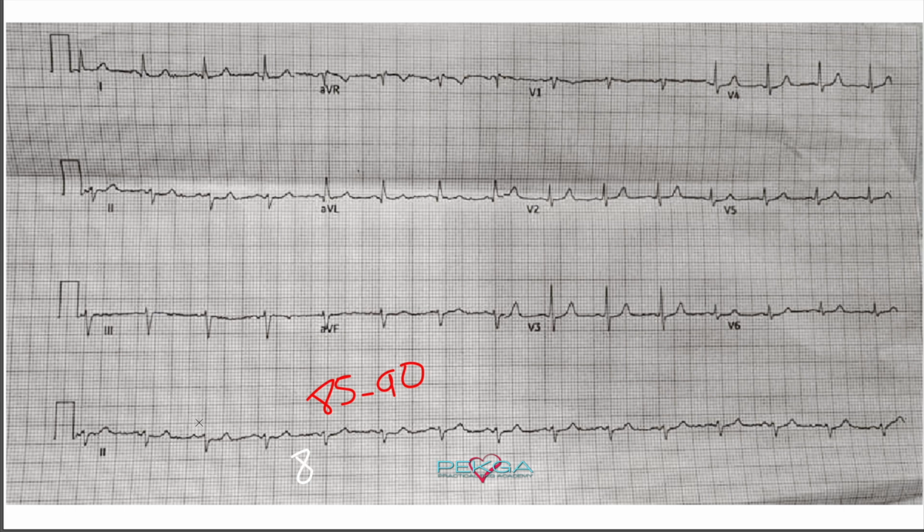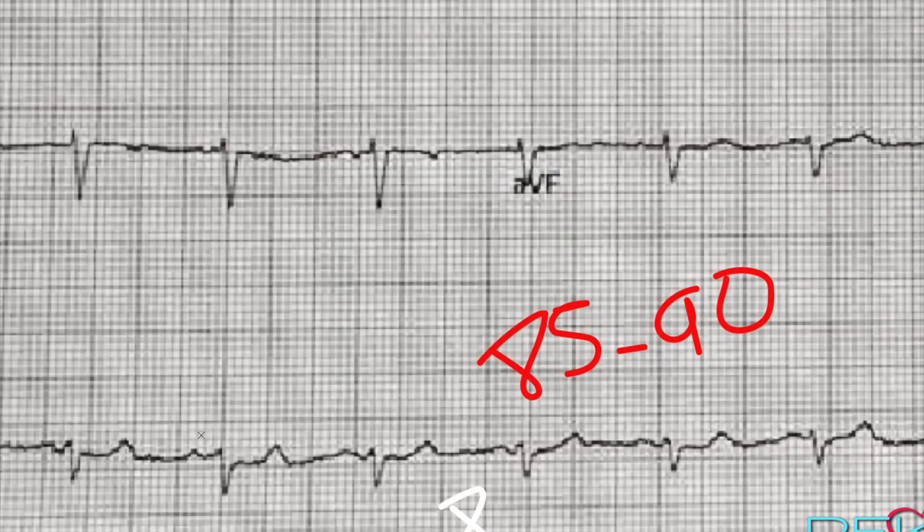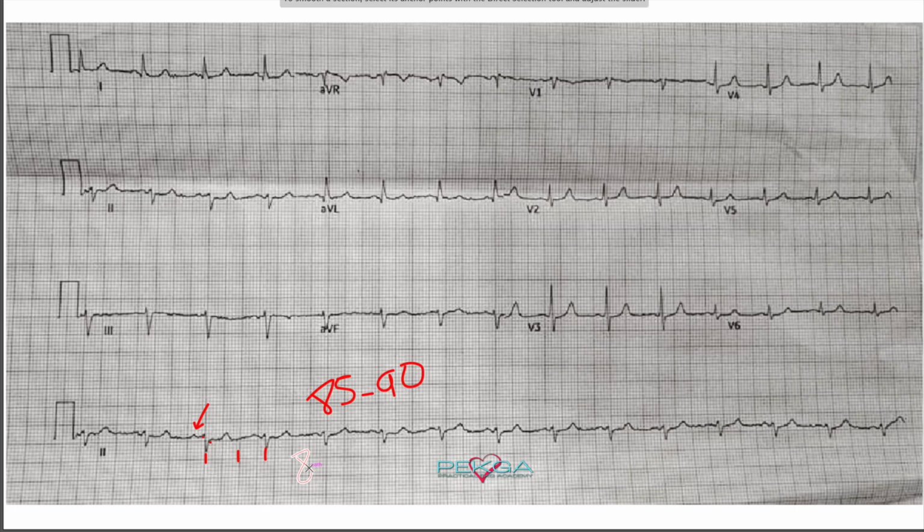However, the P waves now are visible. So see, we can see our P waves here. The QRS is still narrow. It's roughly the same size. The T waves are present. Here we can take a look at our QT interval, right? We get kind of a half line. We don't have any QT issues. I would not say so.